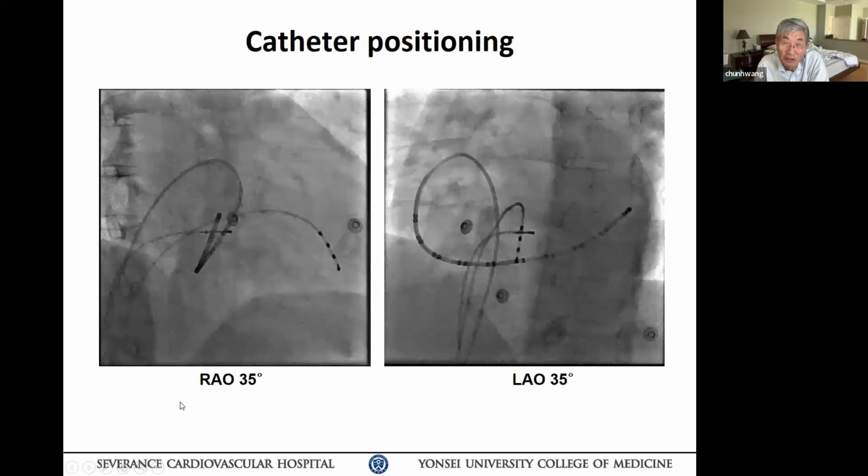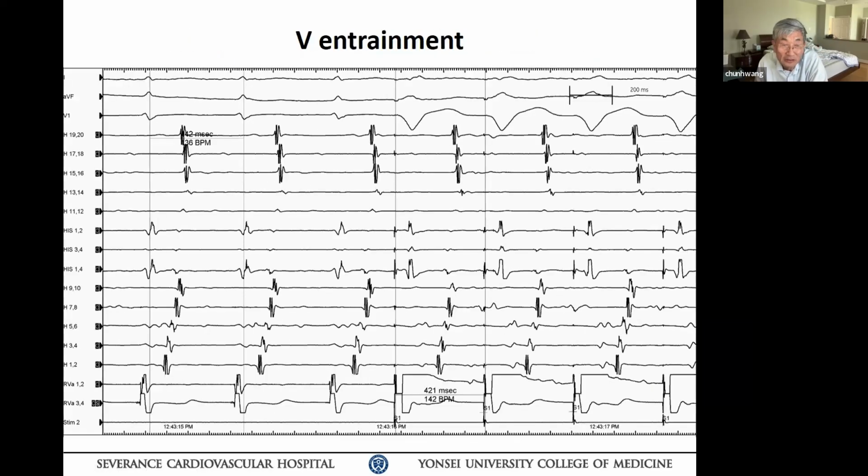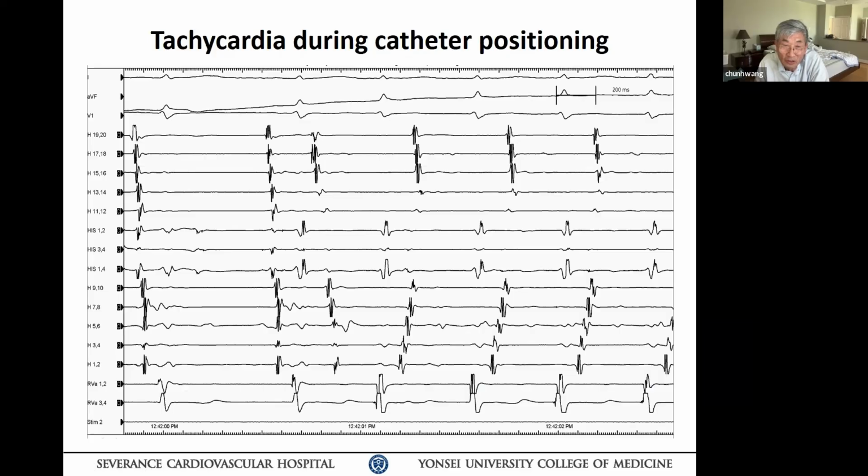Okay, so you did an EP study. You did not have a tracing of baseline here. Now, I want you to look at it. No, stay there. Go back. We talked about this before. If you're thinking of doing an SVT study, why do you have to pace the right bundle? Can you tell me that? Is RV pacing causing right bundle branch block? Does the right bundle fascicle help you or make it more confusing? What do you think, if you're pacing a left-sided pathway?